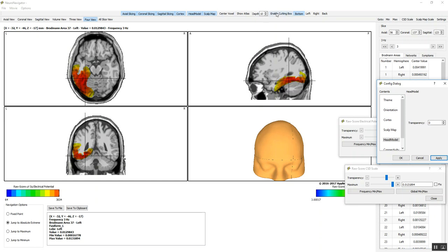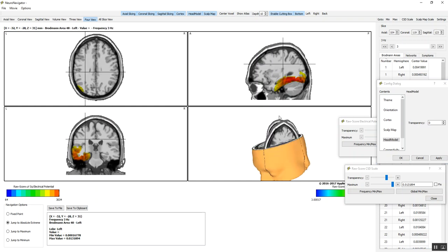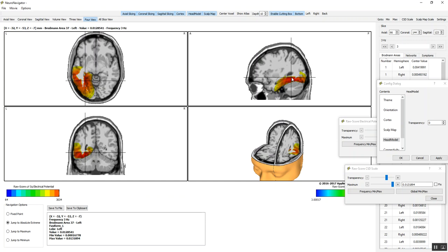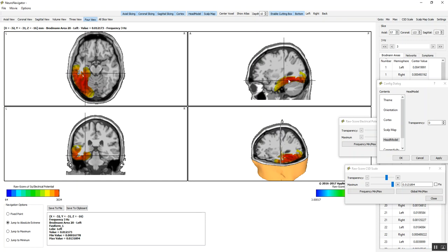And then I'm going to turn on the cutting tool, and then we can go through the brain. Now we have a reference of a face, essentially a rendered face, that gives us landmarks and better understanding of where, for example, you would place electrodes to really get the best recording, which is pretty deep, but it would be in this region here.